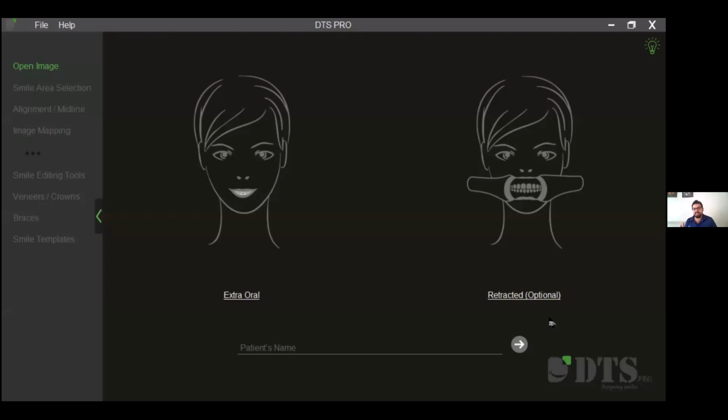So with that little background, what I would like to do is a live demonstration of what my software is all about. It's called DTS Pro. I'm here mainly to talk about the importance of simulations in dentistry, and I will show you how the whole thing is carried out and what digital smile designing is all about. I'll be happy to take any questions at the end of the presentation.